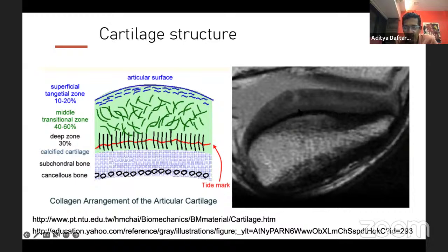You can see here that there's a chondral fissure that comes down into the transitional zone from the superficial zone and gets to the articular surface. So this is fairly classic cartilage appearance on a normal proton density image. And you can see that we can see such great detail of articular cartilage on a regular proton density image that is done well.